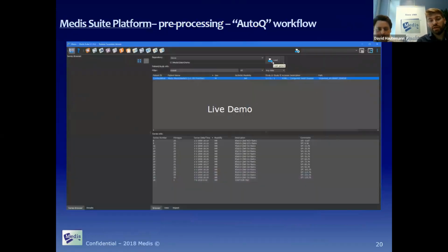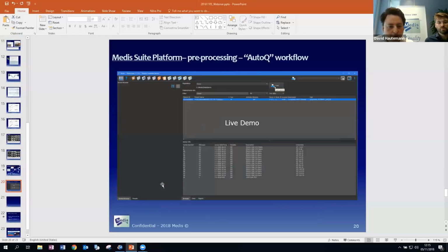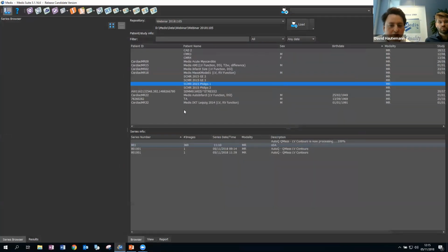So that's my part of the webinar talk, and I'll give the word to David to do a live demonstration. All right, thanks. So I would like to show you how this is going to be implemented now in a Medis Suite workflow. And I have 15 cases here. Let's see how far we can get. The idea is that we launch this this month. So in a couple of weeks from now, it is available in a maintenance release.